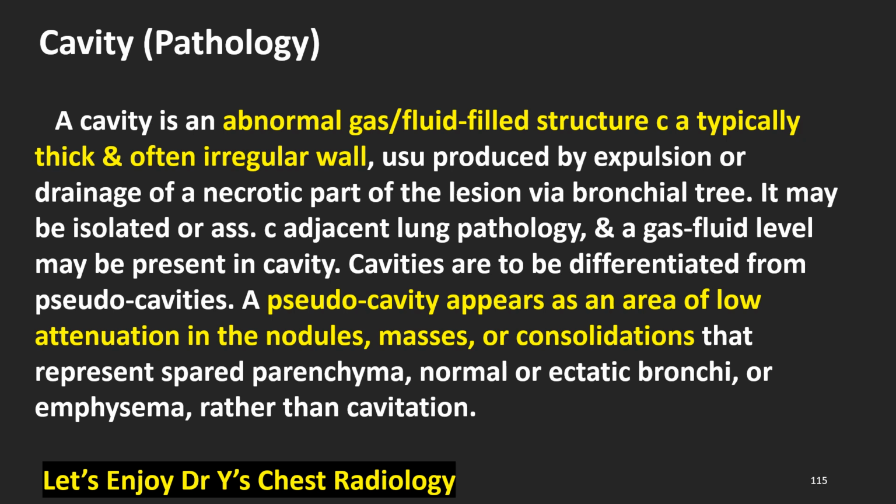Now let's start. Cavity. Pathology. A cavity is an abnormal gas or fluid-filled structure with a typically thick and often irregular wall, usually produced by expulsion or drainage of a necrotic part of the lesion by a bronchial tree. It may be isolated or associated with adjacent lung pathology, and a gas fluid level may be present in the cavity. Cavities are to be differentiated from pseudocavities. A pseudocavity appears as an area of low attenuation in nodules, masses, or consolidations that represents spared parenchyma, normal or ectatic bronchi, or emphysema rather than cavitation.